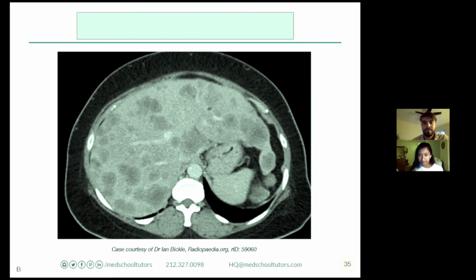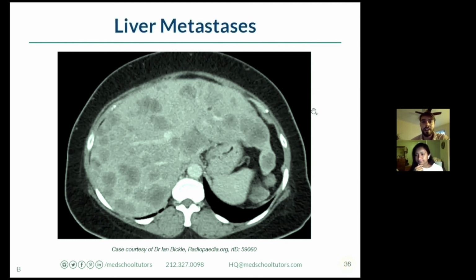Excellent. Very good. Absolutely. And thinking about some of these other diagnoses, echinococcus, things like that, those would have some different findings. You'd expect an eggshell calcification for your echinococcus. We just expect central scarring for, is it fibronodular hyperplasia, is that right? All right. Focal nodular. Focal nodular. Sorry. Perfect.